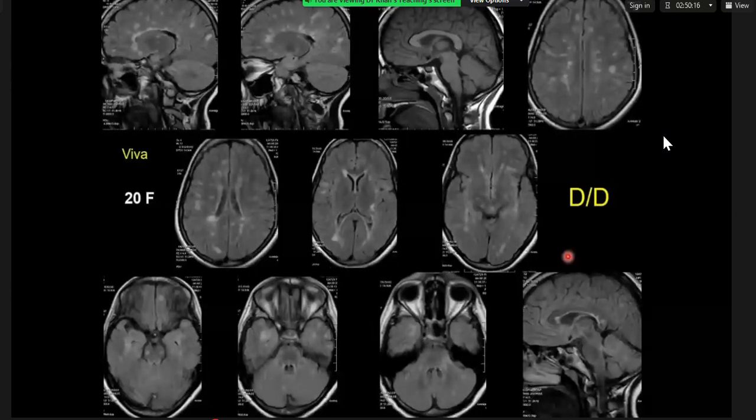So I think my first diagnosis would be multiple sclerosis, given the distribution, because I can see septocallosal changes, Dawson's fingers, subcortical white matter changes. Without any previous imaging, we don't know if there are any new lesions, and we don't know if any of them are enhancing, to further characterize if they're lesions of different time and space. But I think my primary diagnosis would be MS for this patient.